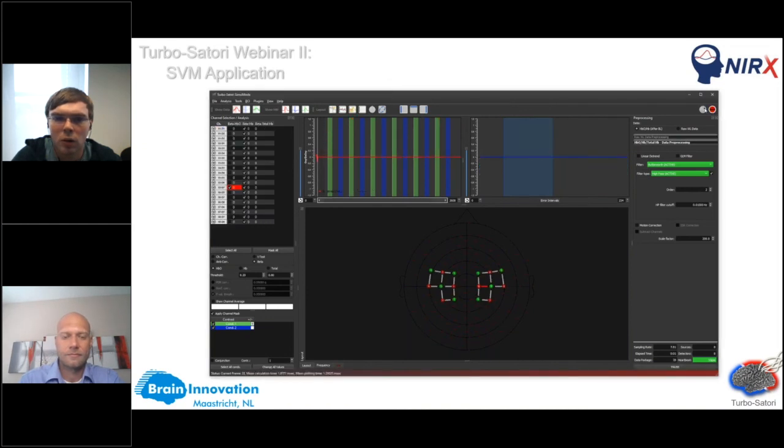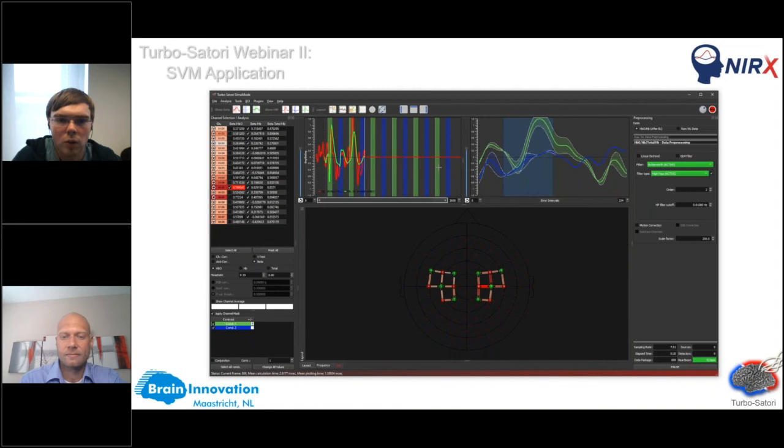You can see how the prediction is performed, and this plot basically shows how your prediction changes over time. Because as more data is coming in, the more information you have. So the difference is your quality. But the closer you get to the end, the closer you should be to the final prediction. So I can just show you this in here.